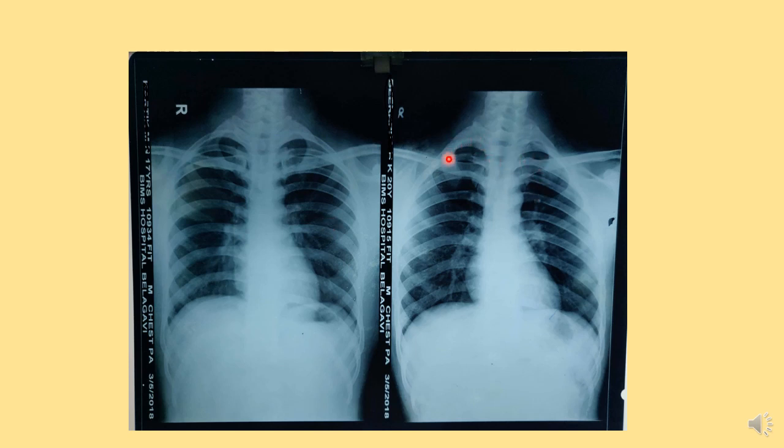Here again, this is the outline of the first rib, and you can also appreciate some amount of blackness in the center here, in the lower part of the cervical vertebra and the upper part of the thoracic vertebra. Here, this is the tracheal shadow. Air is present in the trachea. Sometimes this can also be taken as inference whether radiographically we can decide whether the trachea has shifted to the right or left because of fibrosis of the lung. Shift of this black shadow to the right and left can be easily observed in radiographs as well.